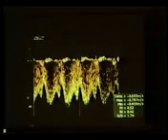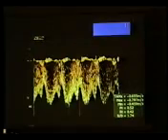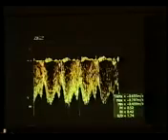ductus venosus. Ductus venosus has been already described this morning by Dr. Tossi, and I'll not take much of time. What I would like to say is that if your machine is switched to fetal cardiac, most of the time in the early pregnancy around 11 to 14 weeks, you may see reversal, which is normal. People call it normal. They never realize that if you have done it in the obstetrical setting, you never get reversal.